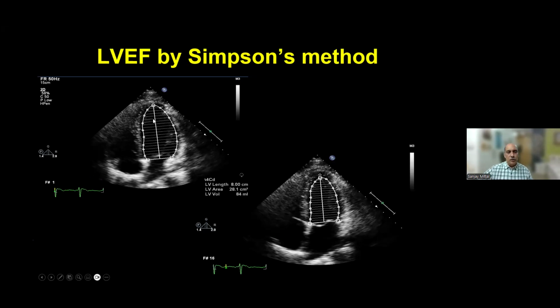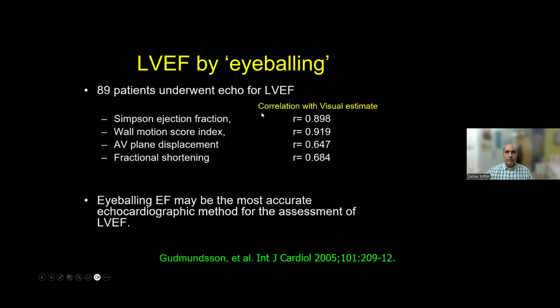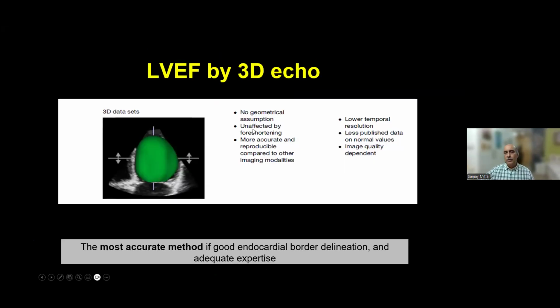More often than not, once you train your eyes, you will be able to guide yourself. Just as I told you about the previous ejection fractions, if you look at the ventricle, you can very precisely estimate the ejection fraction in your mind, which we call eyeballing. For good eyeballing, you should have at least 200 monitored, calculated ejection fractions supporting your estimations. Experienced echocardiographers usually do not do ejection fraction calculations by volume assessments. They can just see and tell you almost within 5% what the ejection fraction is going to be. For beginners and learners, you always have to do the biplane Simpson's method to get a good ejection fraction.